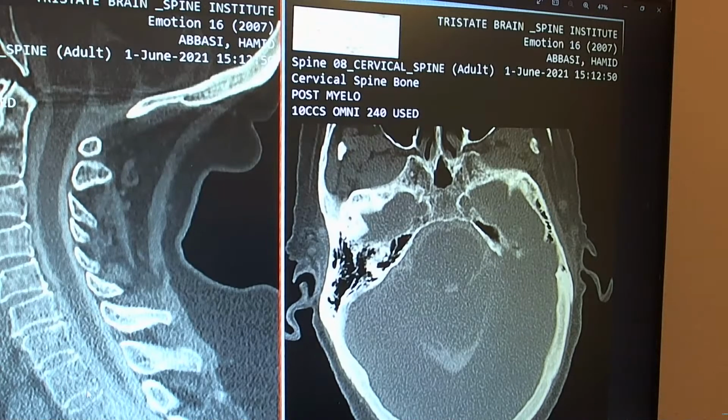We put the contrast in the intrathecal space, meaning that the contrast that you see here is part of the CSF space. Now, what is the structure that separates the cerebellum from the occipital lobe? Anybody else? Okay. Will, fourth ventricle? No, the fourth ventricle would be right here.